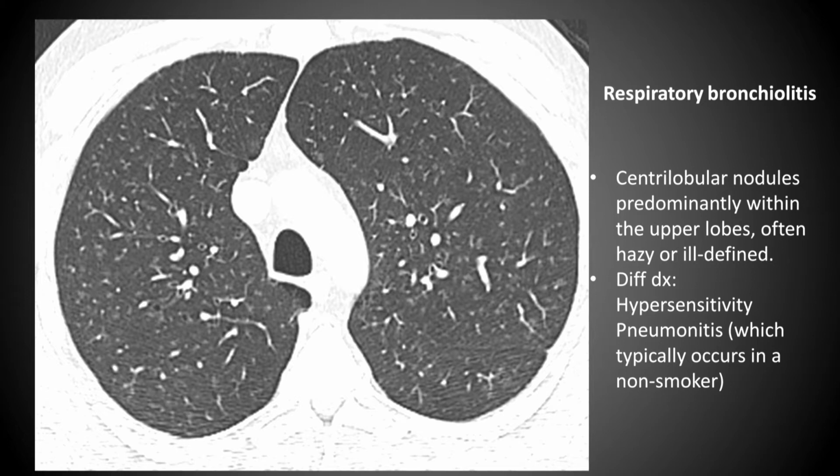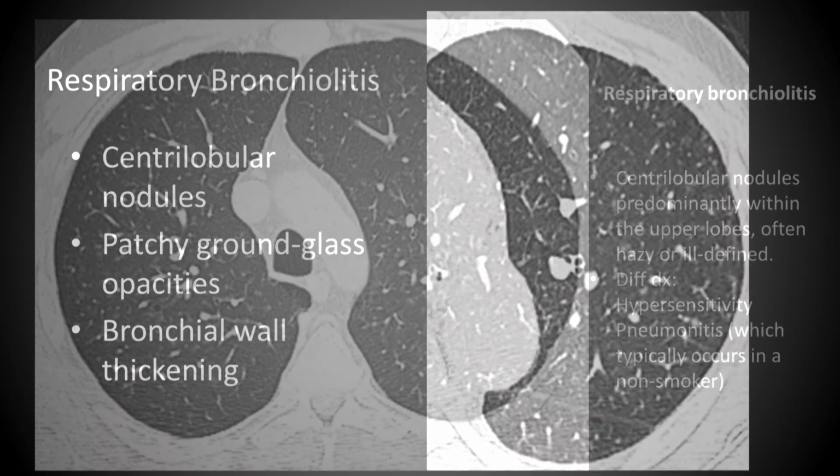And that's going to give you this level of being able to see the finding and having confidence in what the finding is. Now, I will say we go back and do MIPs where we stack them up together and see thicker slices. And we're going to see features in other patients that are going to let us distinguish vessels from disease better. But for the most part, this is the bread and butter of being a chest radiologist, these thin cuts.